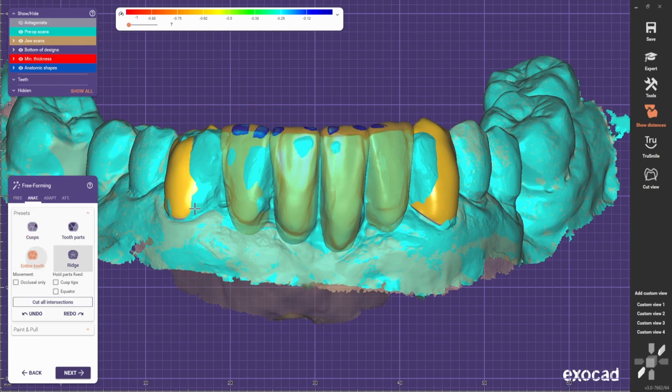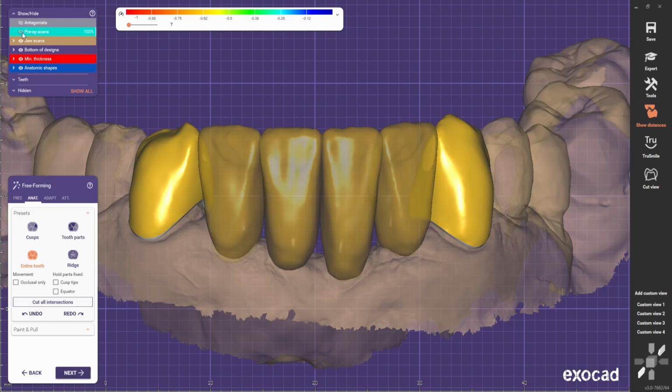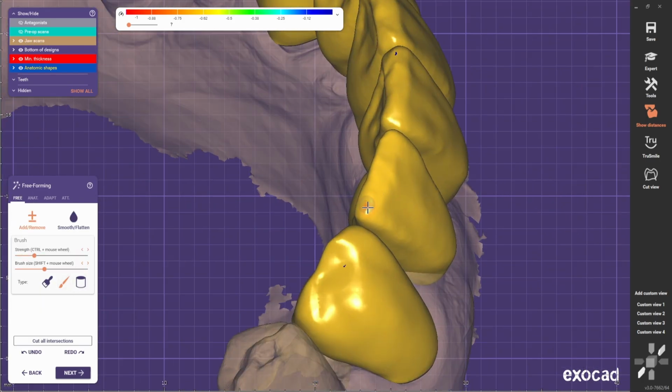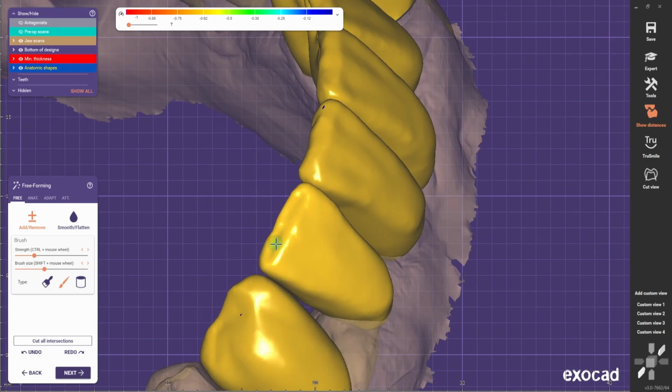We should bring them a bit down, because they are much longer than the pre-op. And now we can actually create some worn incisal edge.